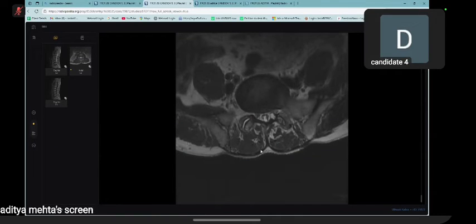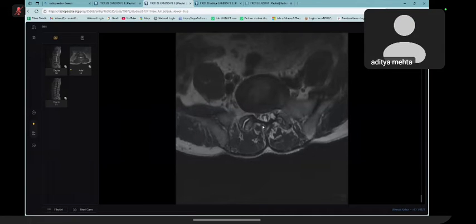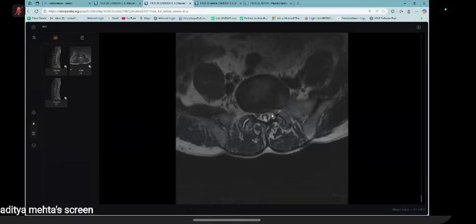In this section, there is maybe a cystic lesion here within the spinal canal. This cystic lesion is known as what lesion? The name of the abnormality or any process related to this? How it arises? Maybe synovial cyst or Tarlov cyst.